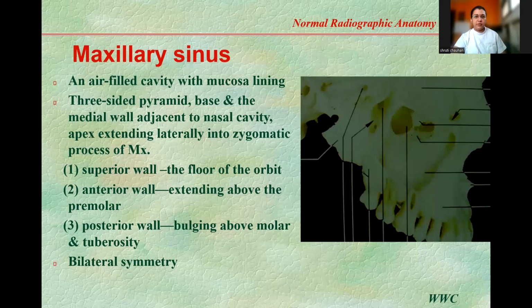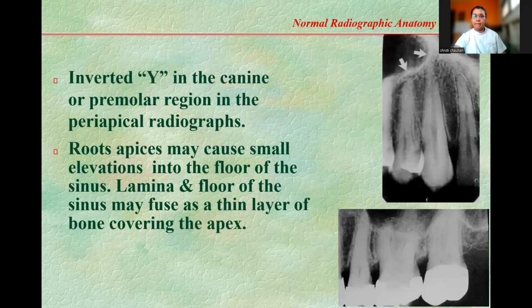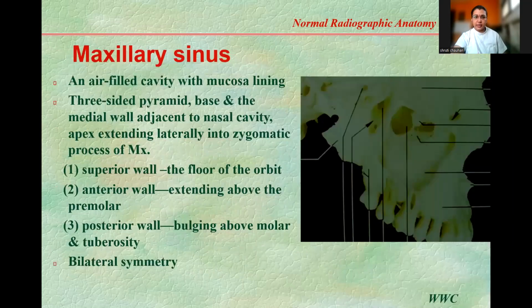Okay, now next. Now we come to your maxillary sinus. So now the maxillary sinus is a very important part. Okay, the maxillary sinus. Now why is it so important? Because it is the major area over here, these two hollow cavities which have a lot of functions, which you must have already read in your anatomy in your first year. All right, so we will start reading this.